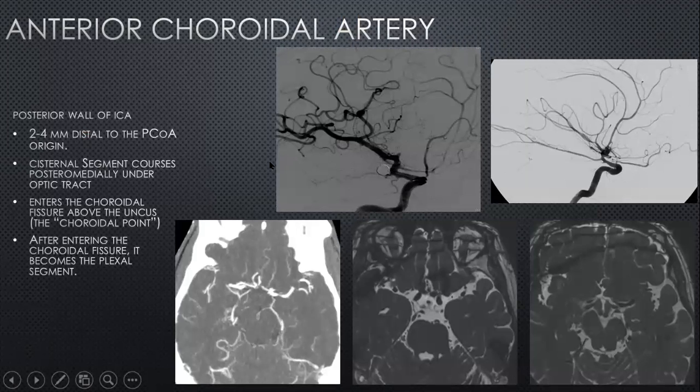Just beyond the posterior communicating artery, a very important artery, though very, very small, is the anterior choroidal artery itself, which passes posteriorly. So this is a high resolution T2. You will have seen these images when we talked about the cranial nerves, the IAMs, the vestibular schwannomas. So you have got the posterior communicating artery, and just beyond that, you get the anterior choroidal artery. So this is the PCOM, and this is just a small posteriorly oriented anterior choroidal artery. And here you have on the CTA again that same artery.